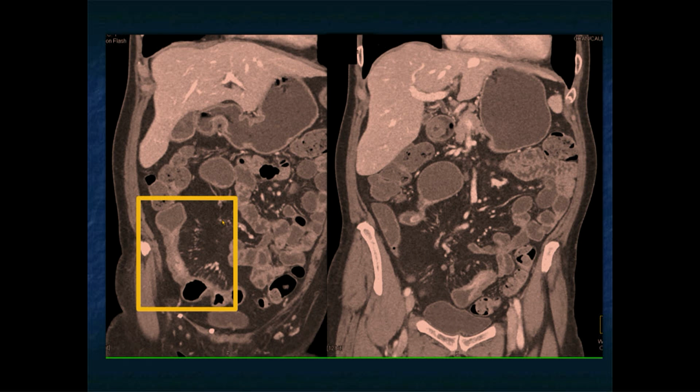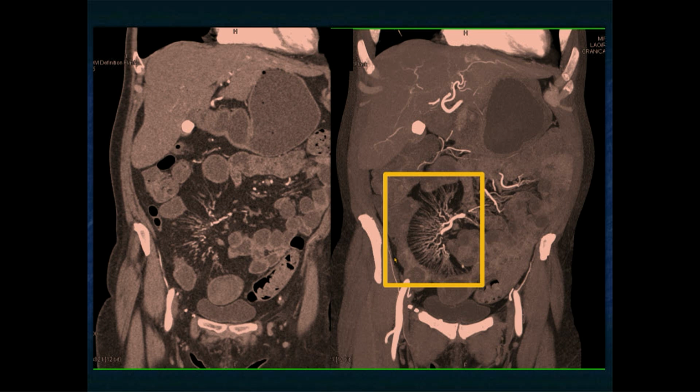When you look a little bit closer, you see this loop of terminal ileum. It's markedly thickened toward this ileocecal valve. And here's that fibrofatty proliferation, also well seen. And if you look at these images with MIP imaging, again, the prominent vasa recta is very nicely shown.